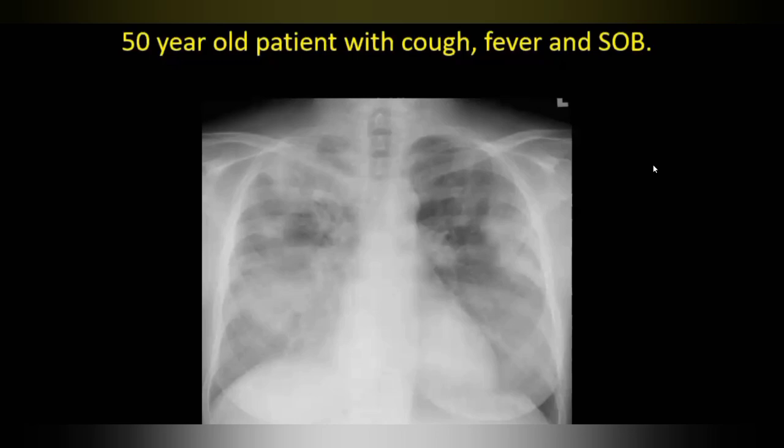So what are you going to do? Sir, I'm going to correlate it with the history of the patient. He has fever and shortness of breath. In our practice, we would advise follow-up after antibiotic cover, and if these are not resolving, then we go for some other investigation like HRCT. Okay, so the patient was treated, there is no response to treatment, so we have to escalate the differential diagnosis.